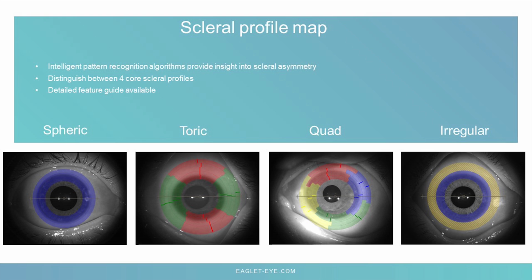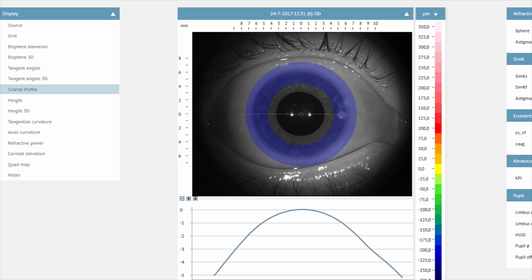I will show with 4 examples and the flowchart how I approach it and the minimum amount of steps required to design a lens. If you just find blue rings, this means that the limbus area and the sclera are more or less spheric in shape. So that means that no quadrant shows a significant difference compared to the others.